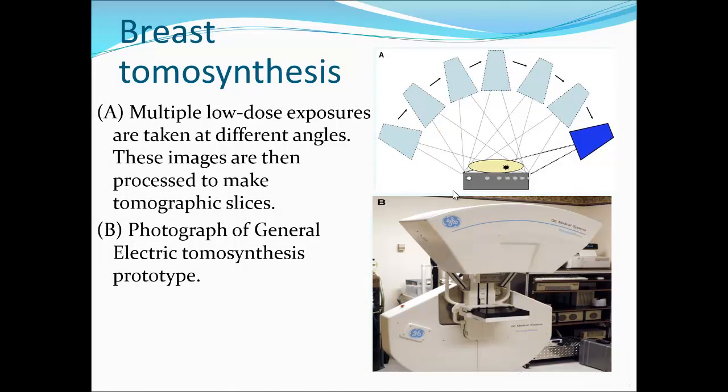Then we have the recent techniques. I will just give a hint because this lecture is mainly basic. With breast tomosynthesis, if you get a better interpretation of the mammogram with the ultrasound, you will not be in need of further advanced investigations, but it aids in the diagnosis.